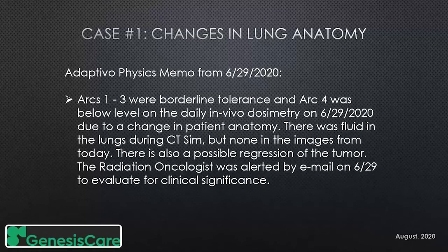There was fluid in the lungs during CT sim, but none in the images from today. There's also a possible regression of the tumor. The radiation oncologist was alerted by email on June 29th to evaluate for clinical significance. So this was on June 29th.